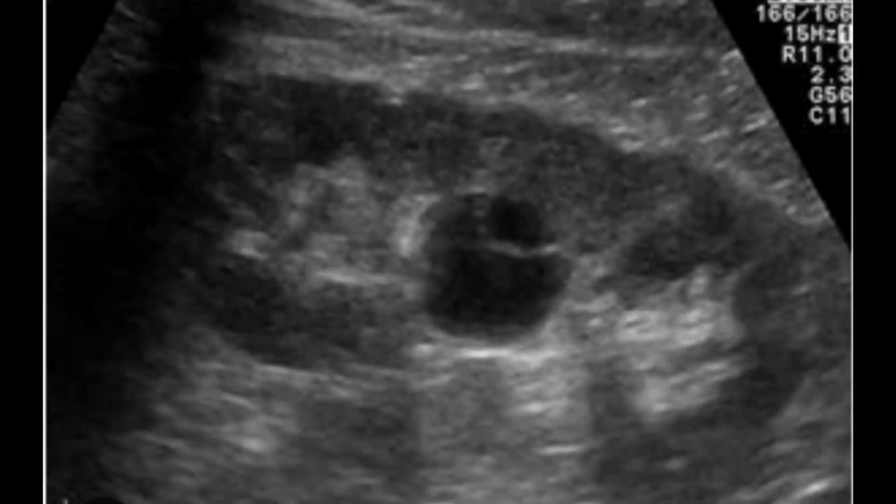Here comes the next category, which is still category 2, but it is 2F. For the presentation of category 2F, which you can pick on the CT scan as well, there would be a slightly thick and irregular wall. As you can appreciate on this image, the wall is slightly thick and irregular. There are multiple thin septations. There will be presence of calcification, and the lesion will be up to 3 centimeter in diameter.